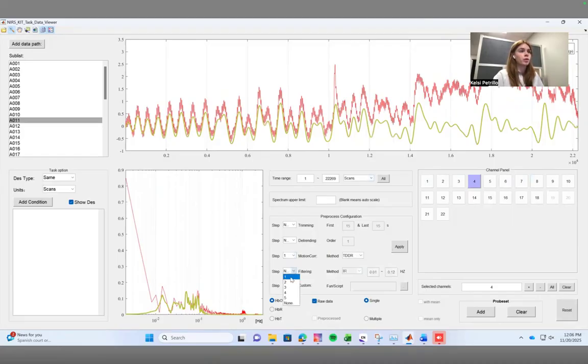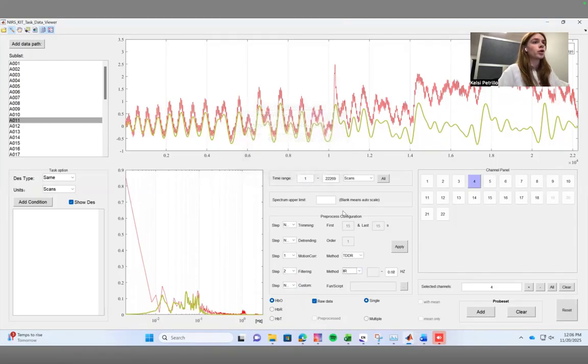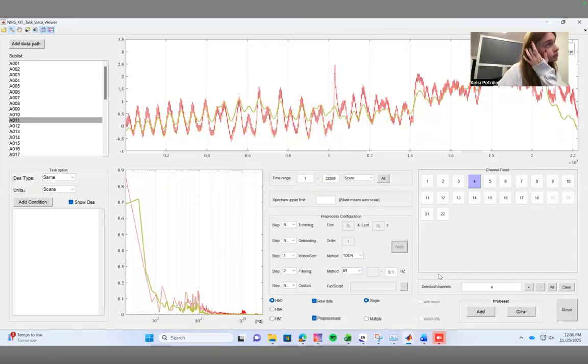And then actually for what I'm going to show in another video for that specific experiment, I did a IIR low pass filter order one, and my cutoff was 0.1 hertz. So if you were going to do that, you could do a quick visualization of that using the data and follow along with how I pre and post process my own data set.